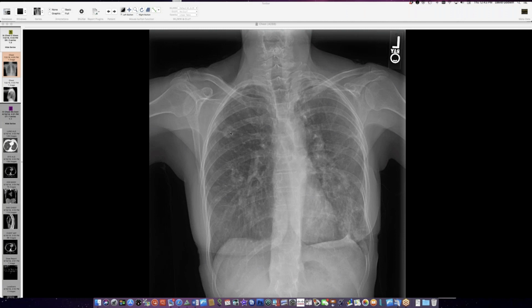She'd been treated for breast cancer. She's currently 59 years old, so she acquired this mycobacterial infection at a fairly young age. And I think it might have been an association with some immune deficiency from her chemotherapy. She had radiation and chemo, so she might have been lymphopenic for a while. Maybe that's what set things up. So now she has this patchy lung consolidation. It's spread down toward the bases.